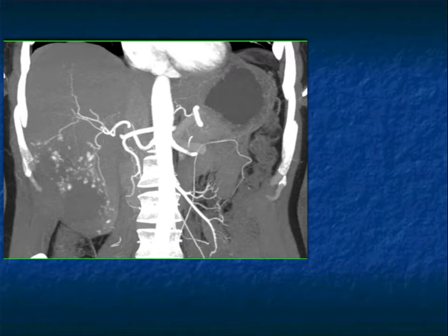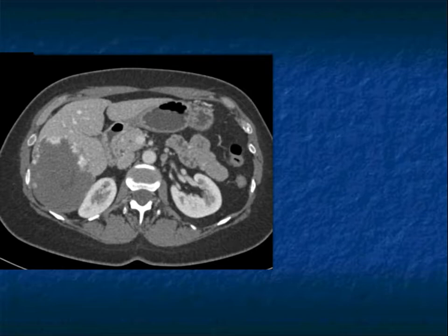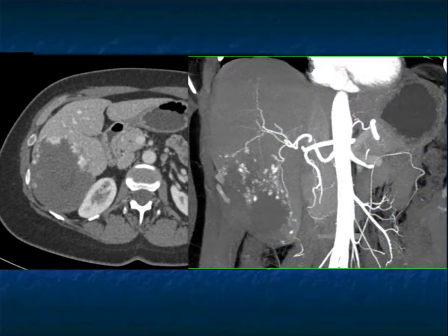The venous phase, in many cases, or even most cases, simply adds to my certainty as to what the lesion is. Very nice puddling. Same case, you see as you go further in how the puddling increases. So you have increased puddling around the edge of the lesion.